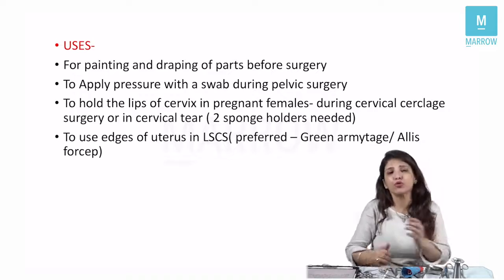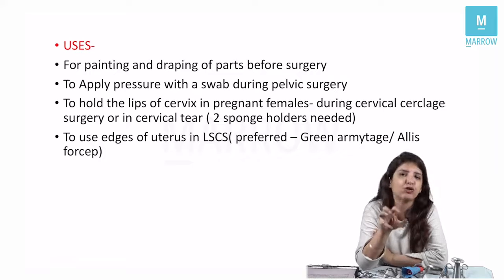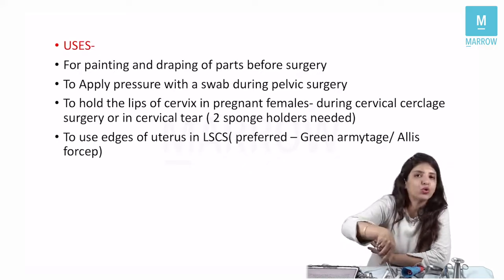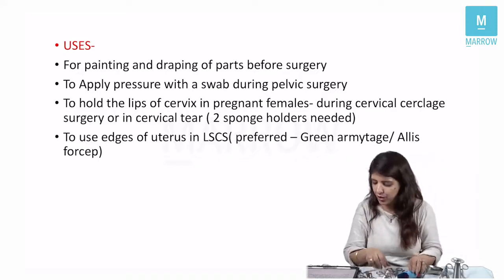Then, suppose you are doing any pelvic surgery and you want to apply pressure on any bleeder at that part. In that case also, I can pick up a swab with this sponge holding forceps. I can go deep into the pelvis and I can apply pressure, right?